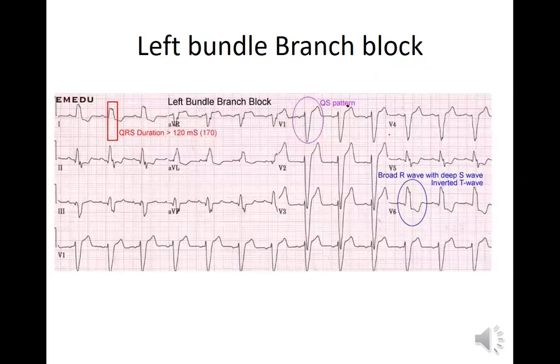Here's another crazy looking one. AVR is good. Let's send them home. No, not yet. Let's keep looking. Now lead 1 looks positive, but something doesn't look right about that R wave. It's not a tombstone, but something's wrong there. In lead 1, let's look at lead 2. We could have a subendocardial myocardial infarction, a possible ischemia, or cardiac tamponade.